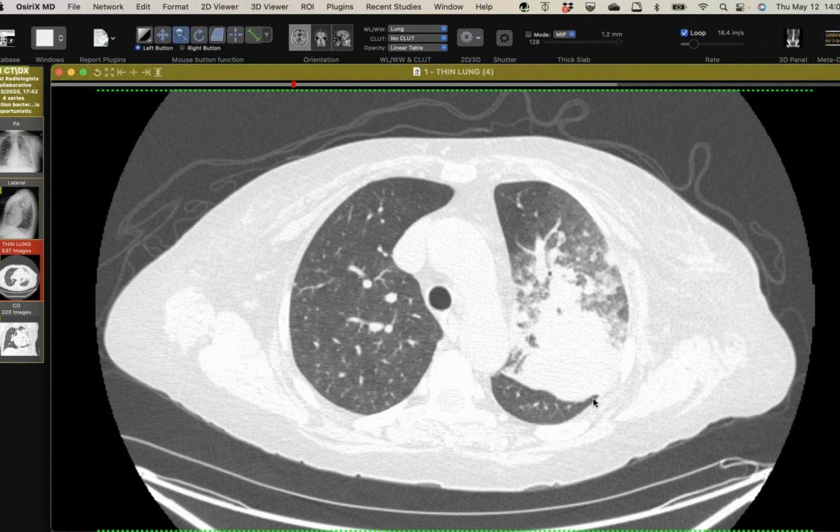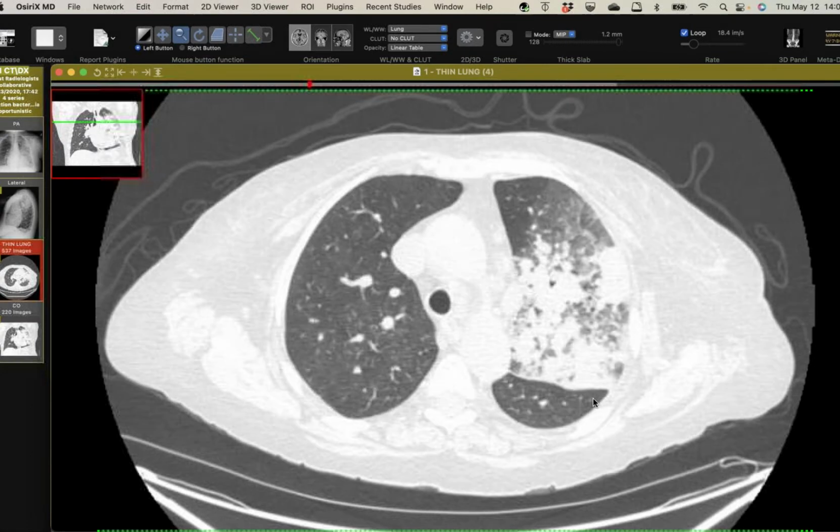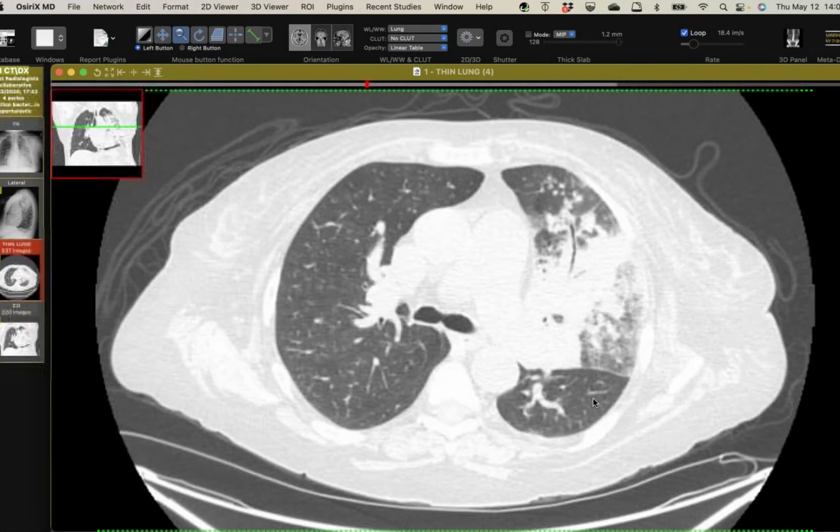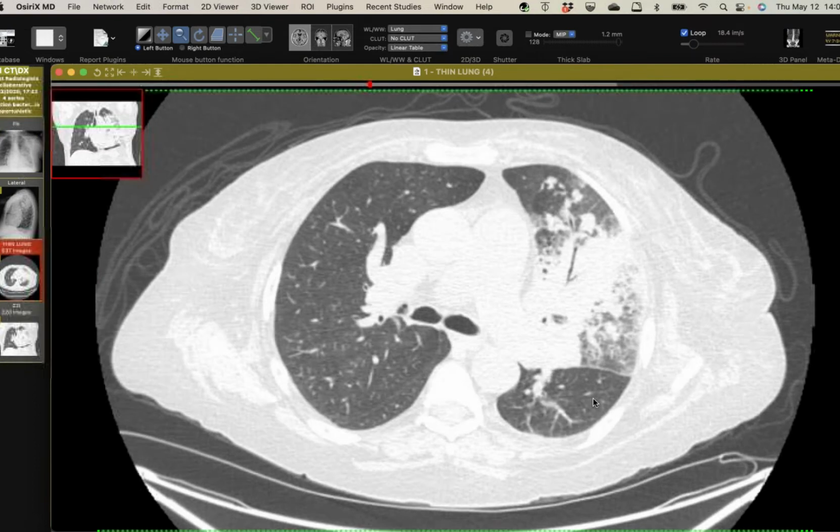I think that used to get thrown in the asteroides complex, but it's one of the more common species of Nocardia. And she had a brain MRI as part of her workup, which showed no CNS involvement. So she was treated with 2 drugs for a year and cleared all of her disease. I didn't save the follow-up imaging. It just shows a little bit of scar. But Nocardia is opportunistic in most cases, and it often looks like a fungus on CT, even though it's a bacterium.